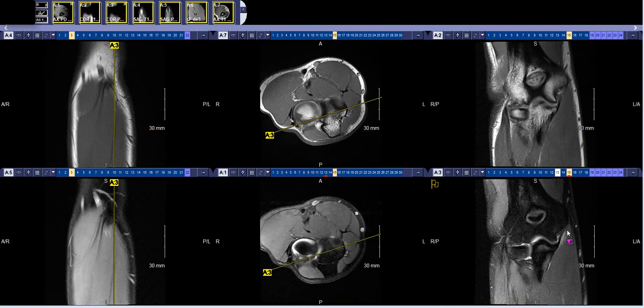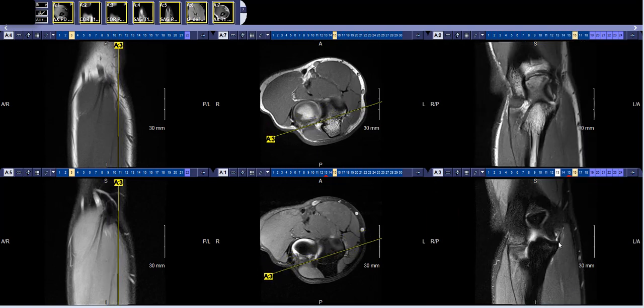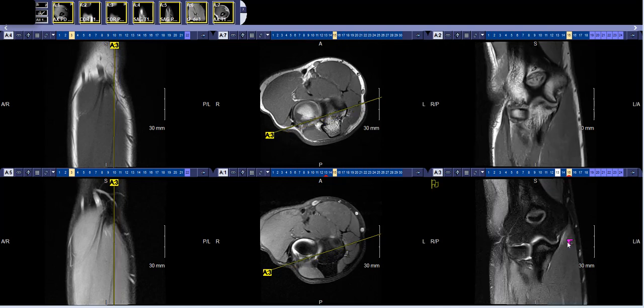But that's where I go next. I look at the ligament there. You shouldn't have much fluid undercutting the distal insertion. You can have really a tiny bit, but usually not much fluid undercuts or strips underneath the distal ligament there.